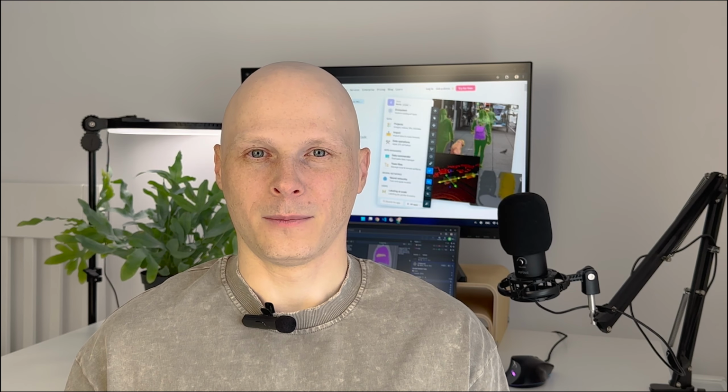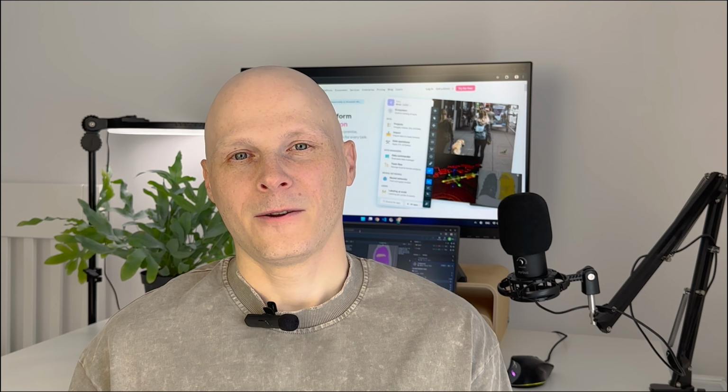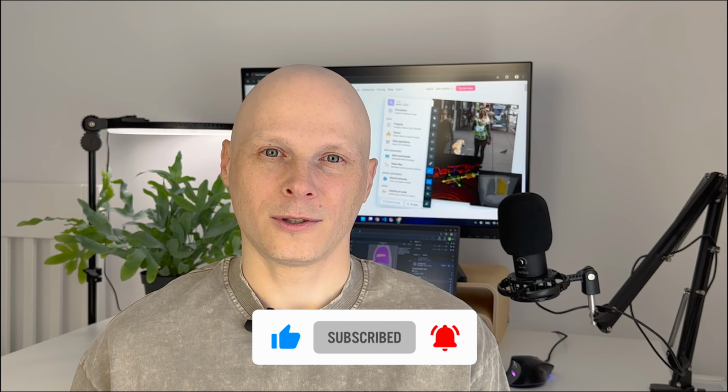In this video, we've seen how two powerful platforms work together, and we've become familiarized with the extension user interface. This technical solution has great potential and may continue to evolve as needed. Write in the comments what you think. It's important for us to get feedback from our users in order to constantly improve our products.